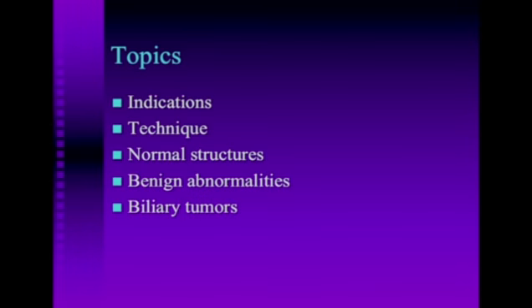In this lecture, we are going to cover the indications for biliary and pancreatic ultrasound, the technique for ultrasound in these areas. We're going to cover most of our time with normal structures, benign abnormalities, and biliary tumors.